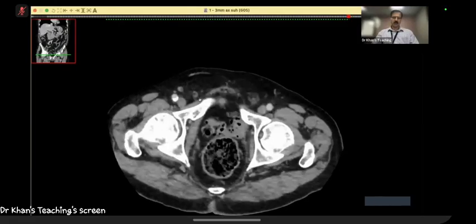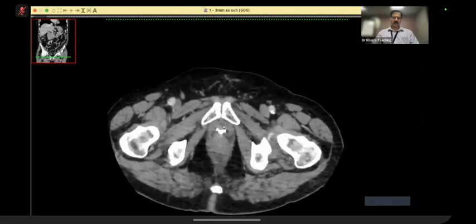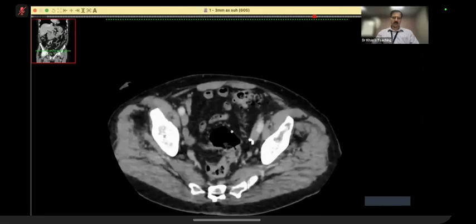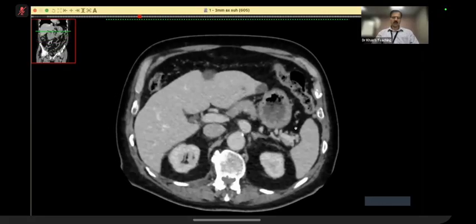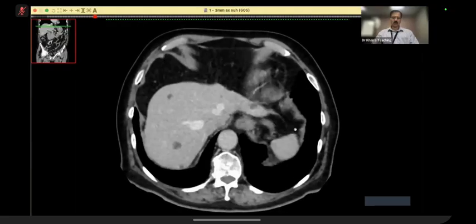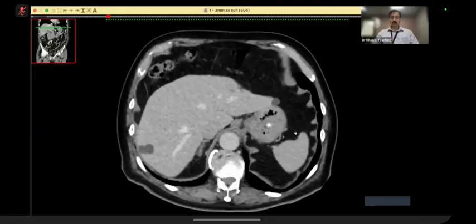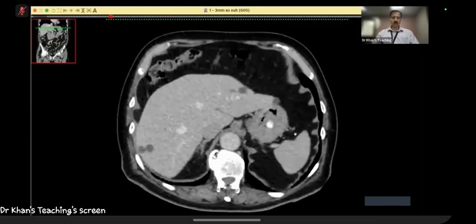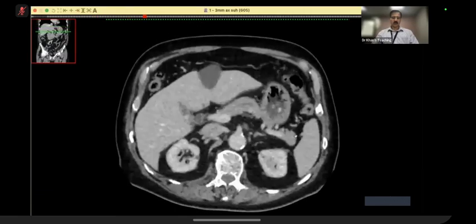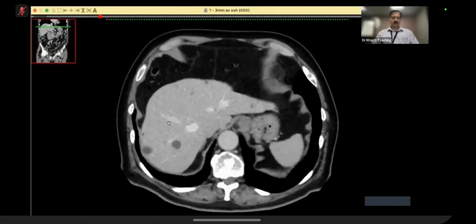The candidate did well where the observation was that the bladder is absent, and it was absent, as I've told you. So this case was a satisfaction of search case. First of all, your knowledge of what has happened. It can be a long case. You have to tell in your report that this is status post ureteric diversion, ileal conduit, etc. These are all simple cysts. These are not metastasis.